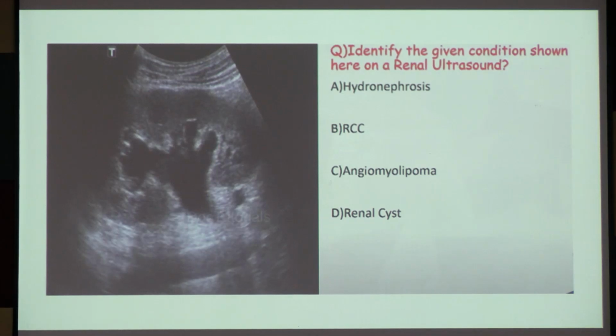Now here what has happened, the entire length of the pelvic calycial system has connected with themselves, getting dilated, almost compressing the medulla. The medulla, the white structure, is almost not visualized. If we have even more time, this cortex will also get compressed, and the kidney gets damaged. So this is a basic thing that will be asked in examination. What is a renal cyst? What is a hydronephrosis? The difference between the two things. Okay?